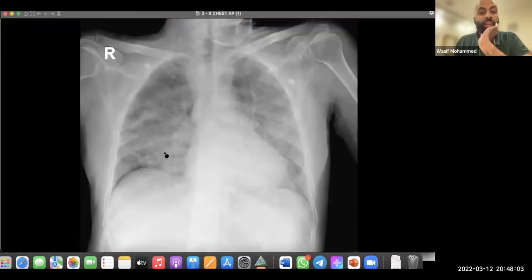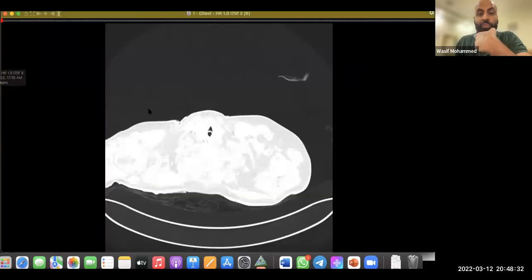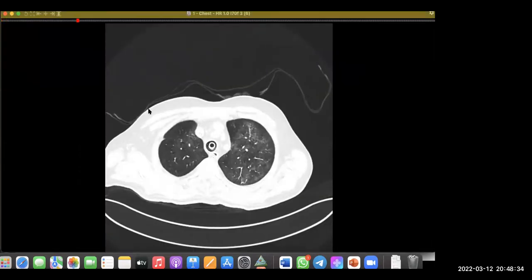So, bilateral perihilar opacities in a batwing configuration. I don't think the pleural effusion is significant, at least. You have mild cardiomegaly. Here again, you didn't bring up the clinical history before you went to the differential, right? You just directly jumped to ARDS. You went on about 3-4 things which were not the diagnosis in this case, and then you thought about asking the history. So bringing in the history before the diagnosis can save you some time in the exam.